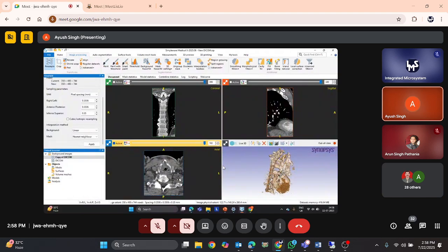So this way, we can upsample the data set so we can have a better visualization of the same data set. Because earlier this was divided into single slices and now the same operation has much better clarity in the next slice view. So in medical cases, we can definitely upsample the data set to have better clarity. Now, this was one such operation that we considered under the pre-processing section.